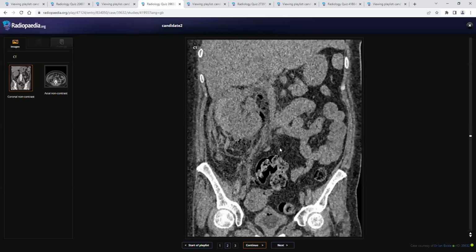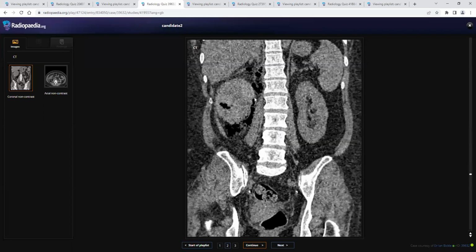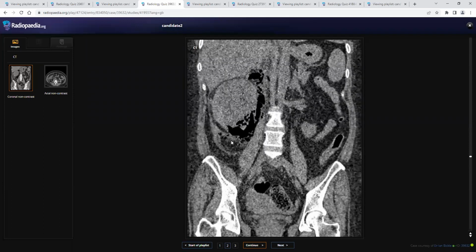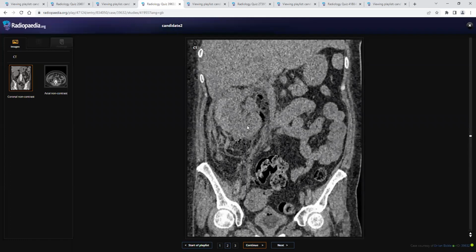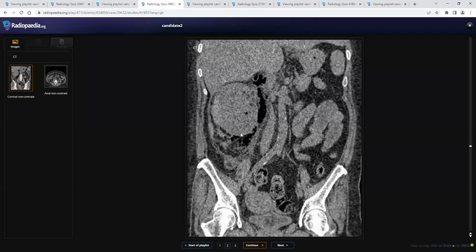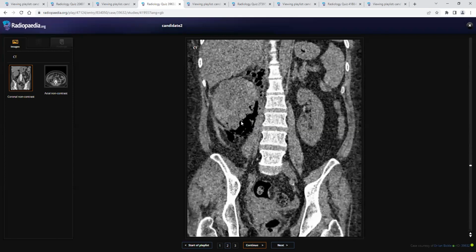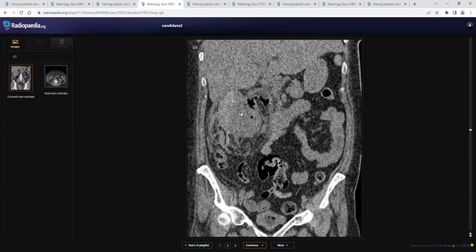Okay. So this is a coronal CT non-contrast of the abdomen, and it shows multiple flecks of gas surrounding the right kidney and within the right renal parenchyma as well, with multiple fat stranding. The right kidney appears enlarged with surrounding fat stranding and fluid signal. So this confirms the diagnosis of emphysematous pyelonephritis. Okay. What do you do next?